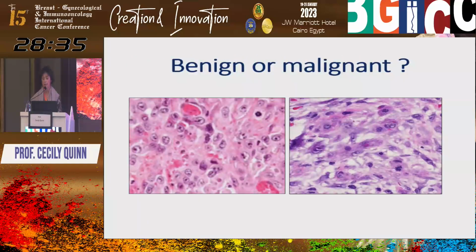So I'd like to start first of all by showing you these two slides, and I'm going to ask you to decide which is benign and which is malignant. And at the end of the talk, I'll tell you which is which. I think you'll agree that based on the available evidence, it's very difficult to distinguish between them.